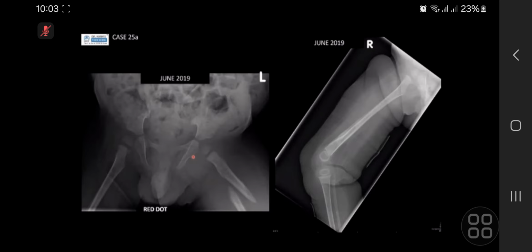Okay, next case. This is a difficult case. So you can ask me questions, or I might give you hints. We've got a series of studies. It's a story case, okay? So have a look at the first X-ray. Tell me what you see, but don't give me a differential first. Then I'll show you other images.